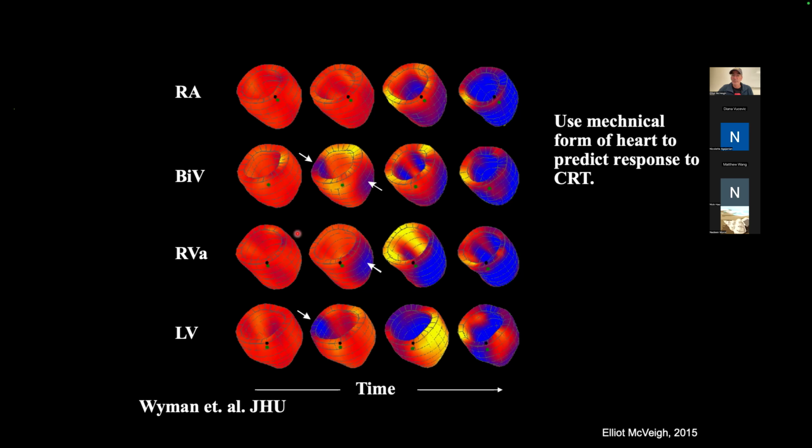However, we made this by having a pacing lead here. If we turn this pacing lead off and we turn this one on, so this one's on the LV, the base of the free wall of the LV, we get essentially the same behavior. It's just the origin of the strain is now at this pacemaker, right, or this pacing lead. And so you can see early contraction, nothing going on over here. And then as the contraction moves to different parts of the heart, we see a bulge on the septum. So the septum goes backwards, and then the septum contracts late. Okay, so that's that desynchrony.